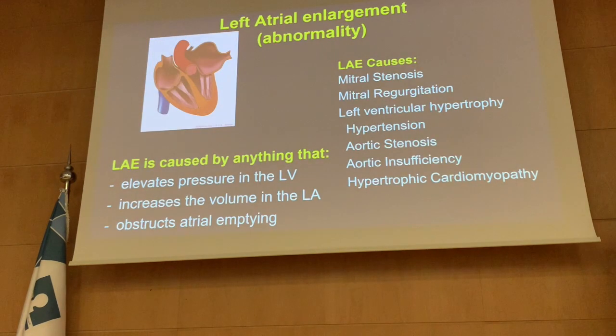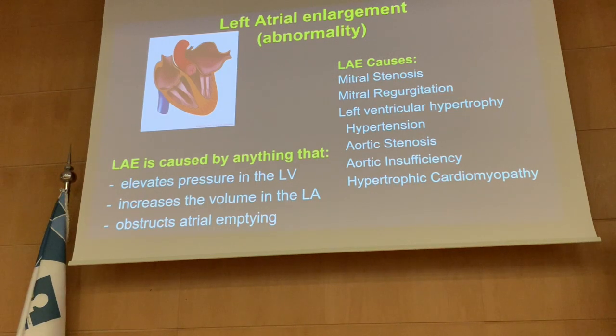So who is going to give a summary? Yes, please. In case of rheumatic heart disease, which here is mitral stenosis, in lead II we will see two portions of the P wave, and in lead V1 we will see a big deflection. If you want to make it simple, you can call this a double shape, bifid, or M shape.